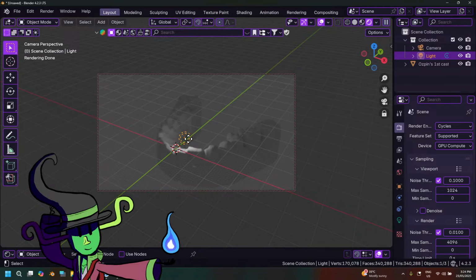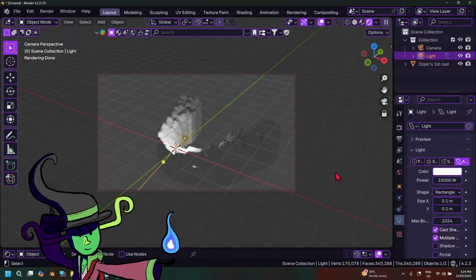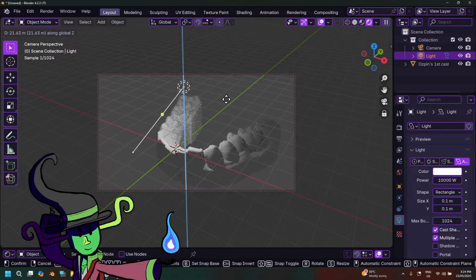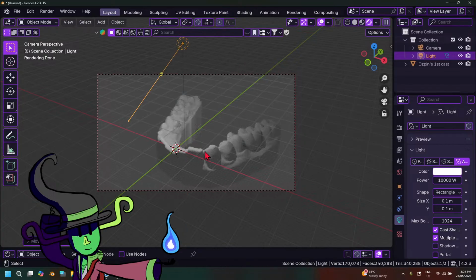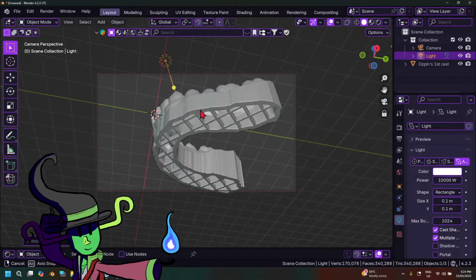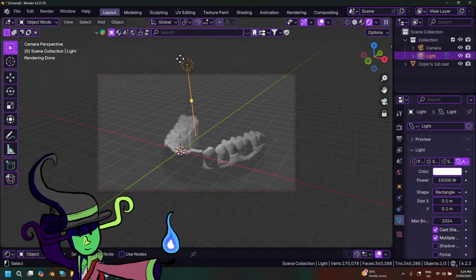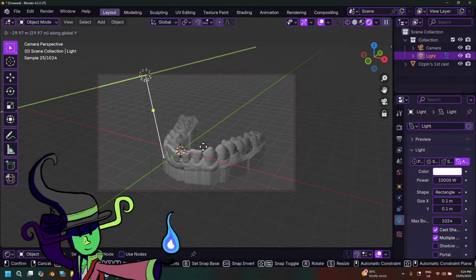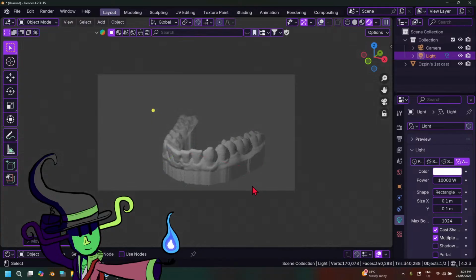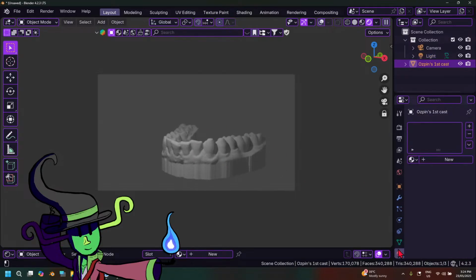And if I just change up the power of my lamp here, something much more unique, you can see that you get a better looking 3D cast that reacts to more realistic lighting, compared to, for example, solid mode here, which looks so ugly. You can go to Blender, get a better photo of the cast you created, and look at that.